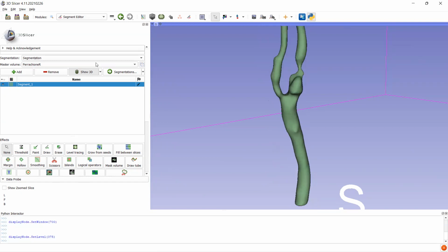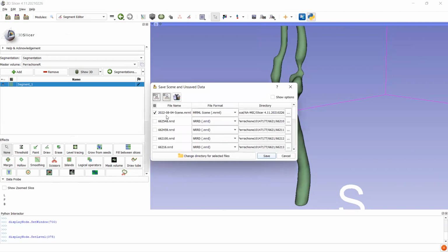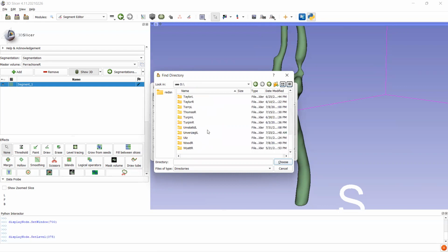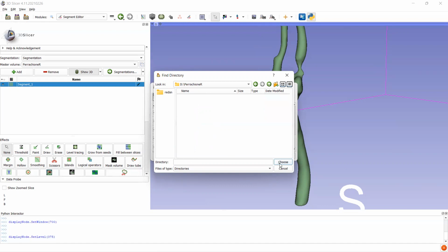And now this is very important. Once you've exported everything, you're going to want to save. You're going to want to save this all. So save everything in this, and then you can reload it at this exact point, this current scene in Slicer, which is what you're going to want to do. So now, if anything needs changing, it's really easy to change it.